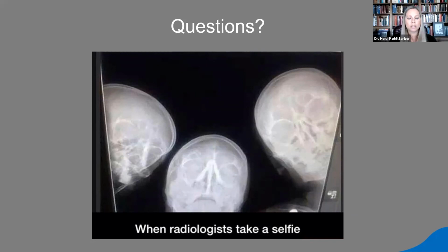So I'm going to say, first of all, what we are responsible for with our images is exactly what we've always been responsible for. Actually, all of the information in our CBCTs, we can see in a pan. So if you're taking pans now, you technically are responsible for everything that you would see in a CBCT, but it's much harder for us to see it because we have all of that 2D superimposition. So from that standpoint, I would say it's almost better to take the CBCT than the pan because you can compare bilaterally and see what's happening.